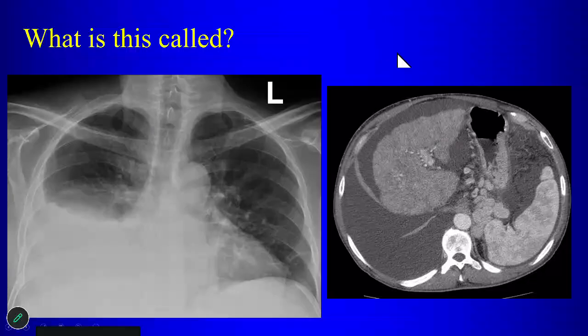Sam, you kept talking about the liver. Well, here you go. Yes, yeah, that's terrible cirrhosis. All right, so what's going on in this patient? Right-sided hydrothorax in the setting of cirrhosis. So what do we call this? What's the term? Just hydrothorax. There's a term when there's liver disease, hydrothorax is just the non-specific term for pleural, right? Hepatic hydrothorax. So we see that quite a bit.